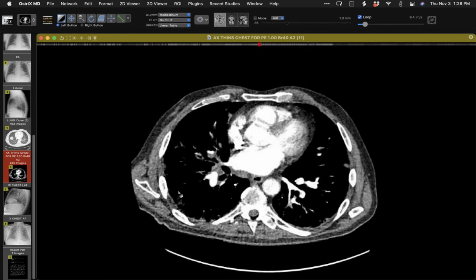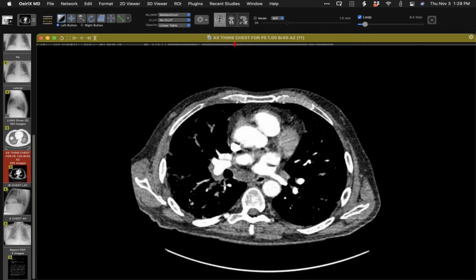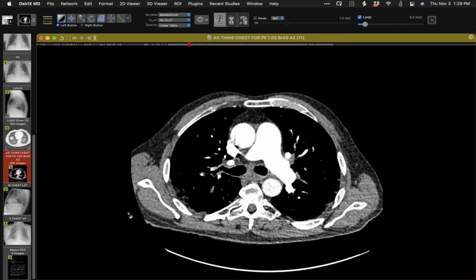I would attribute what we see here presumably to lymphoid tissue that's waterlogged, some edematous lymphoid tissue. So the dominant finding is florid interstitial lung edema over many months. And he ultimately went to transplantation. So before I show you the report of that, any thoughts for this?